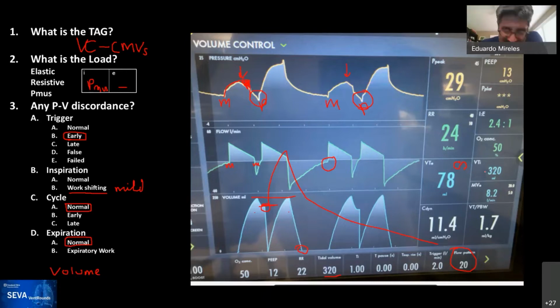Yeah. It looks like you got an inhaled tidal volume of 320, just what you have said. What's the problem, right? But if you recall, the area between the flow curve and the horizontal time axis is proportional to volume. And as you can see, the first two breaths get to 320 mLs, but the big exhalation is twice that area. So that's really what the inspired tidal volume was for that particular exhalation.